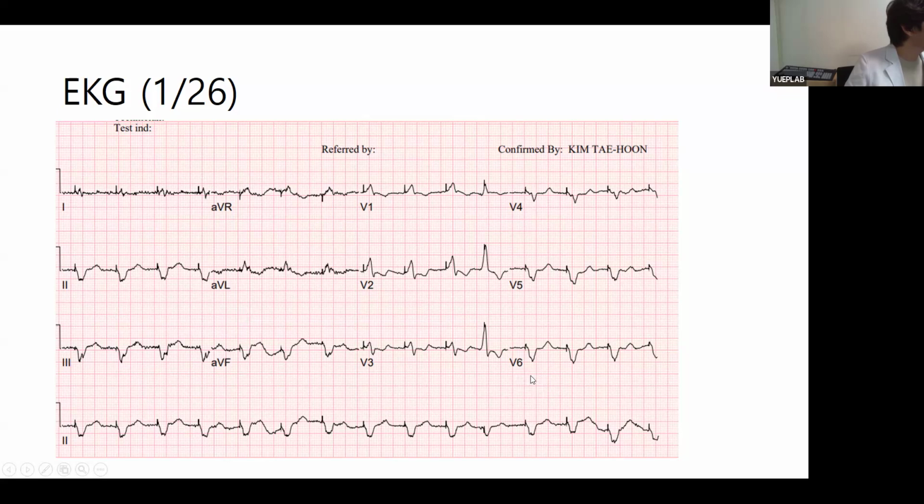And usually the LV lead position is recommended in a non-apical position, basal or at least mid position. So the negative polarity in V6 is not that bad, but it is not that good.